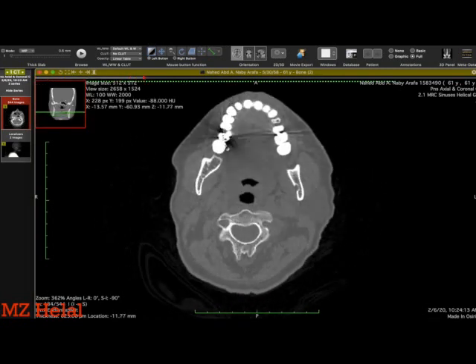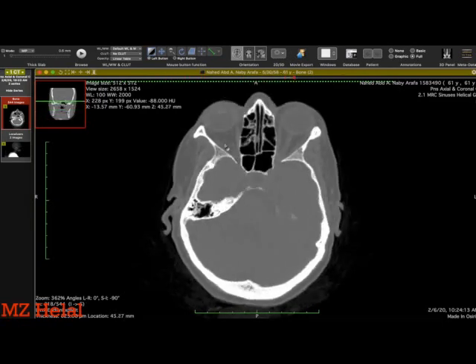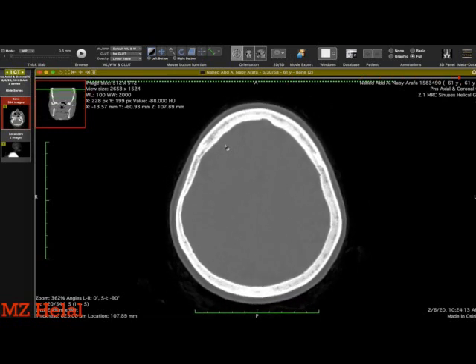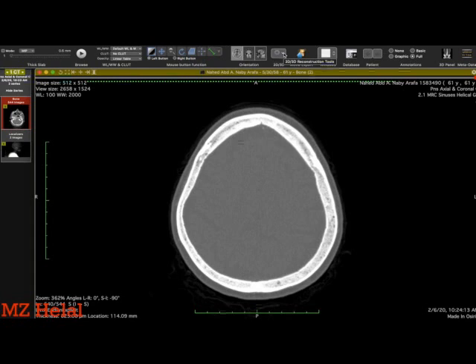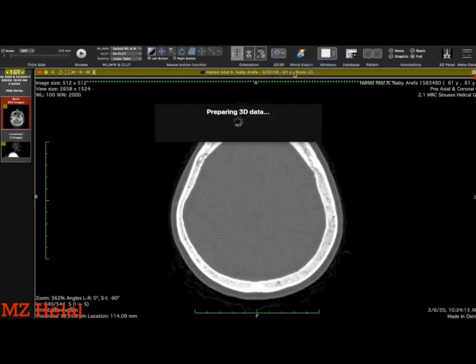And usually if you have a window, you can see these cuts in axial cuts only, but in this software OsiriX on Apple, you can go here and choose to get a multi planar reconstruction.